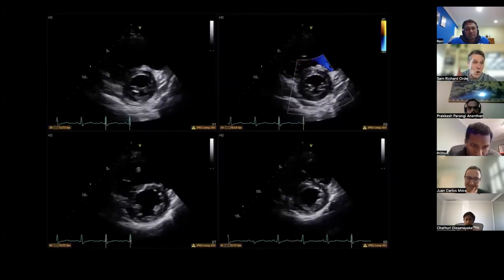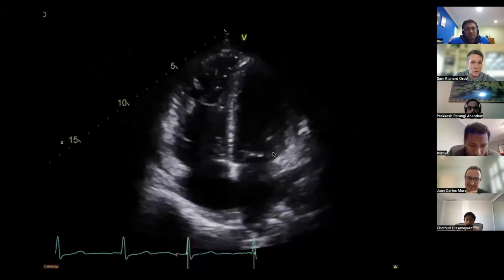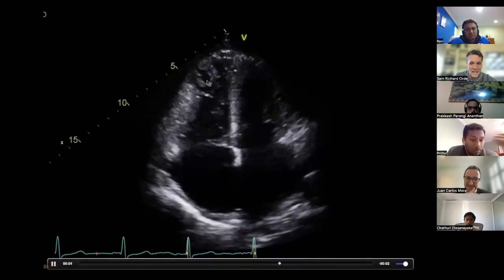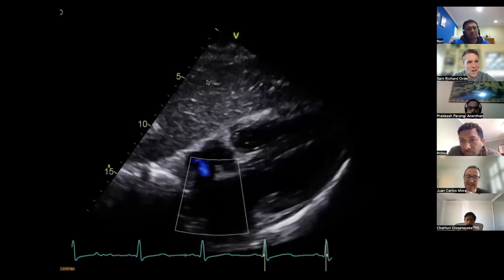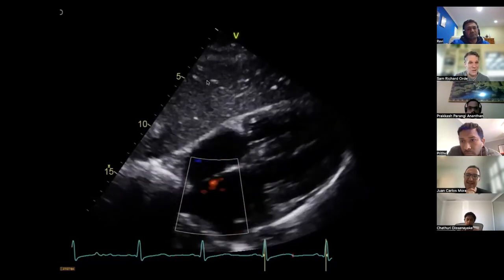But this guy's got an enormous right ventricle. And why does a 32-year-old have an enormous right ventricle is really interesting. And absolutely, you've picked up the idea, which is what this image is meant to push you towards: does this guy have a shunt? I think this probably does not support the idea that he's got a shunt.